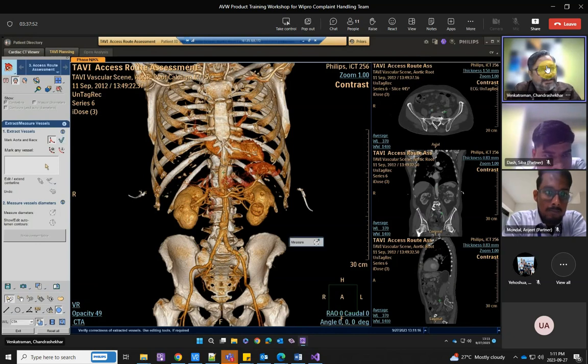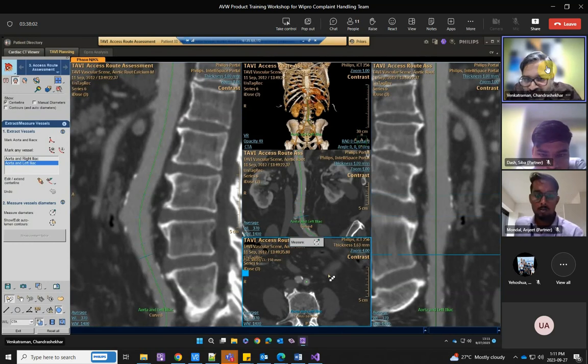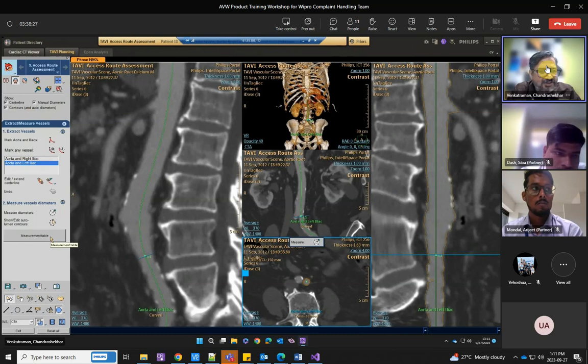it will calculate and the layout will reload, and we choose which point we want to work on. If there is any narrowing over here, or any measurements or contours we want to define, we can do that automatically. These calculations and reference lines are also available. Instead of drawing the ROI yourself, measuring by drawing lines myself would be really time consuming. So we do have tools which do that, and then you add these measurements onto this measurement table.